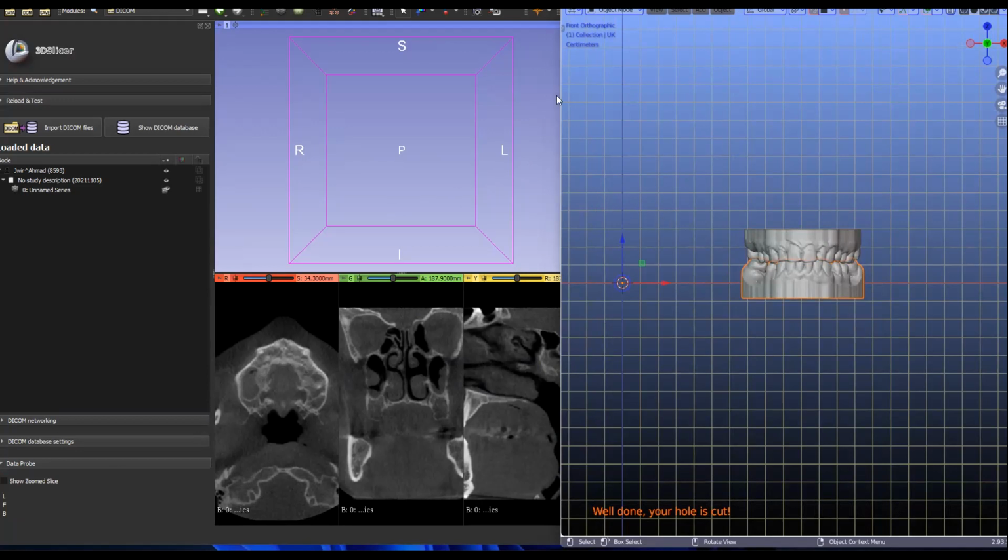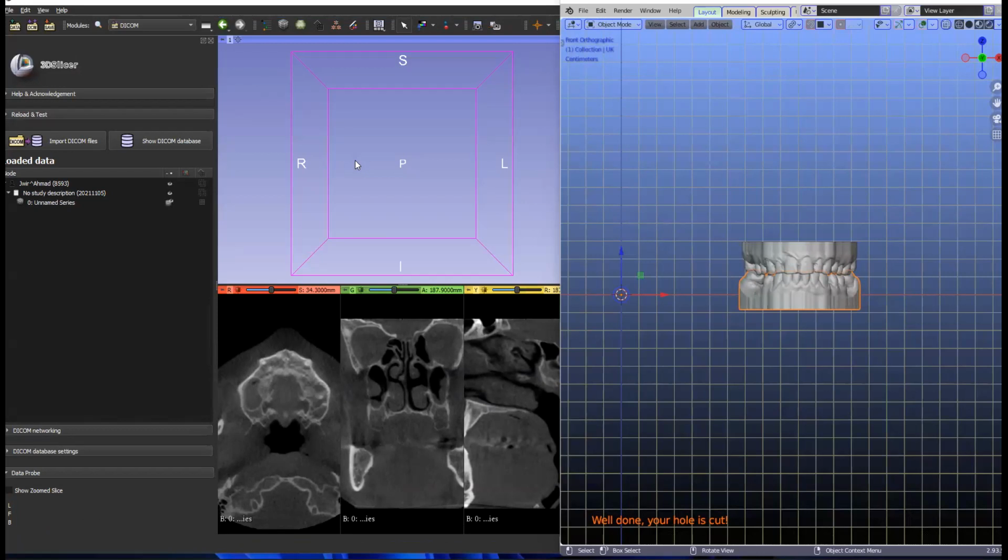So we know that we need implants, we need to align the models to the DICOM, and to do that we need a segmentation model. And this is where it all starts. This segmentation model is a printable STL file, by the way. So let's go into 3D Slicer first and start.